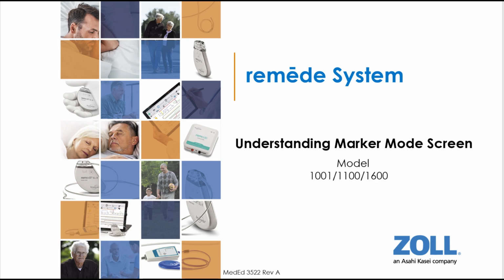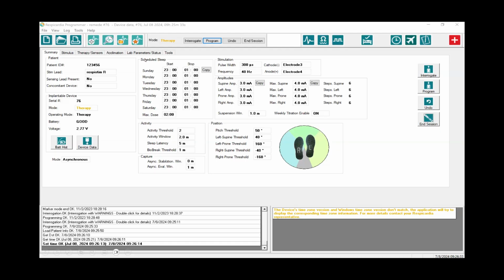Understanding the marker mode screen on Remedy models 1001, 1100, and 1600. Understanding what marker mode is, when to use it, and how to set it up. Marker mode is a feature that allows users to view live Remedy system data collected by the device. Users can also review previously collected marker mode waveforms and data.